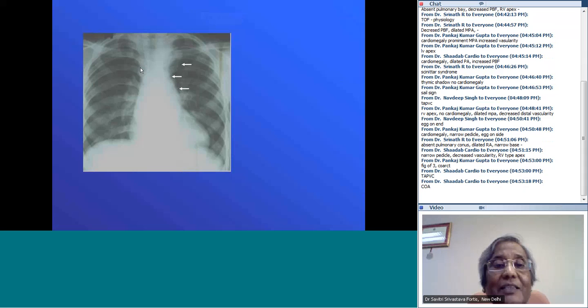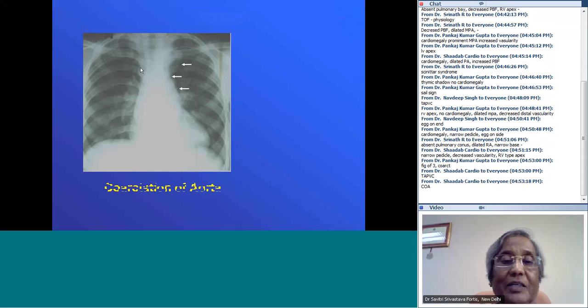So this is a typical X-ray of a coarctation of aorta. This is the site of coarctation. This is the dilated segment of the left subclavian artery, and this is the dilated segment of the descending aorta. So this gives a sign, which is the E sign or 3 sign, whichever way you are seeing it. You are seeing here an E sign, and you can see the other way around like this, and this will again be a 3 sign.